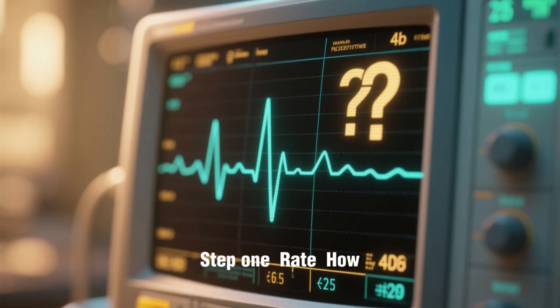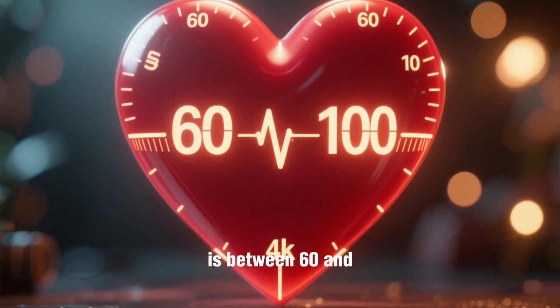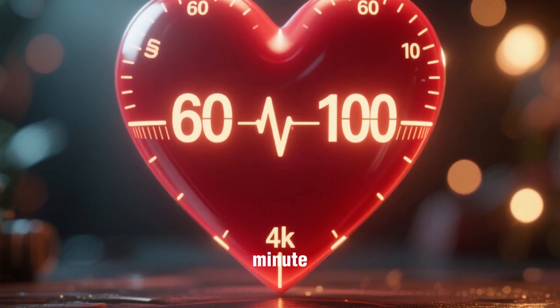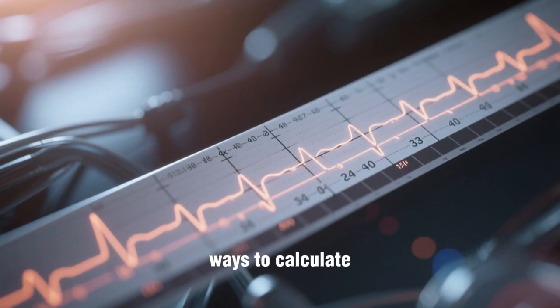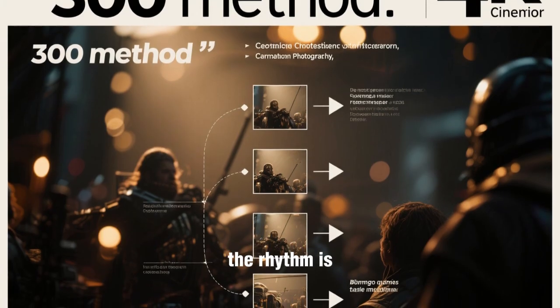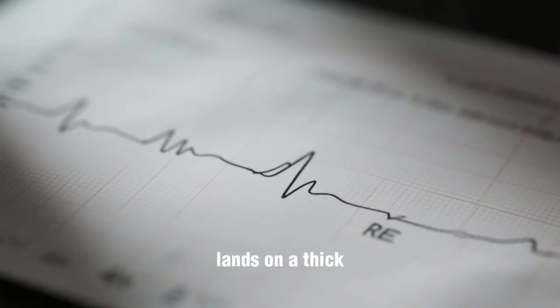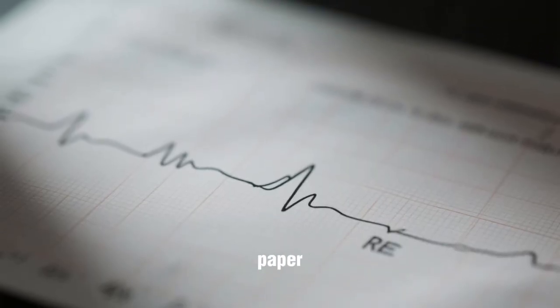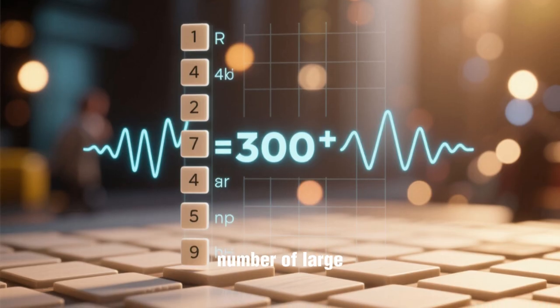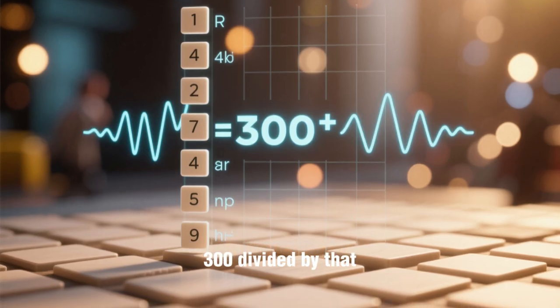Step 1. Rate. How fast is the heart beating? A normal heart rate is between 60 and 100 beats per minute. There are a few ways to calculate it from an ECG strip. The easiest way, if the rhythm is regular, is the 300 method. Find an R wave that lands on a thick line on the ECG paper. Then, count the number of large squares to the next R wave. The rate is 300 divided by that number.